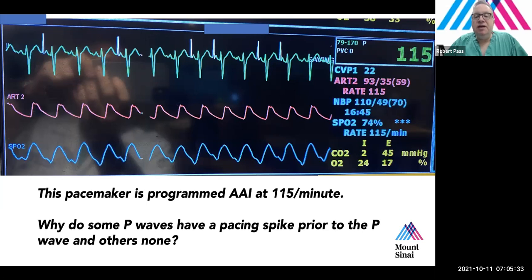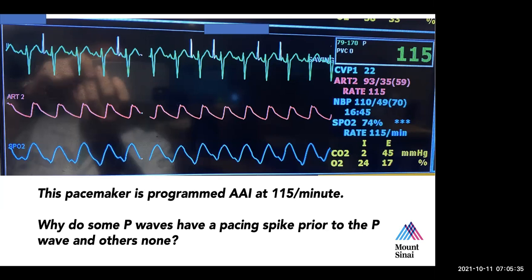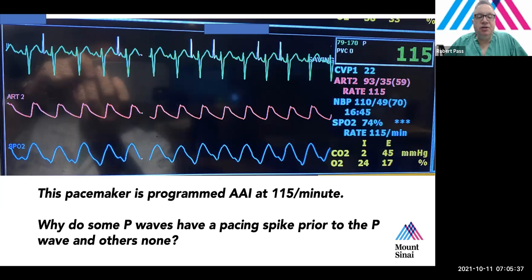So you would go to the pacing box, and you could tell from it what the device is actually doing. The key here is that the presence of pacing spikes does not necessarily equal the presence of pacing, and the absence of pacing spikes does not mean that you're not pacing. The other thing that's important is you want to look for the P wave.